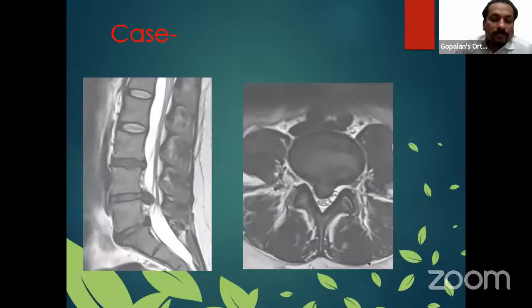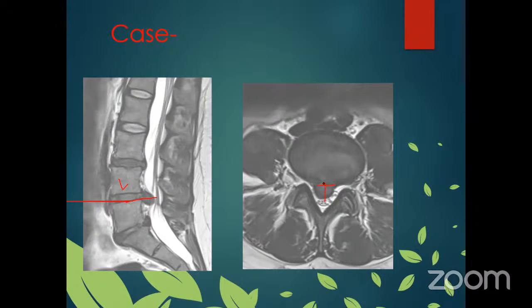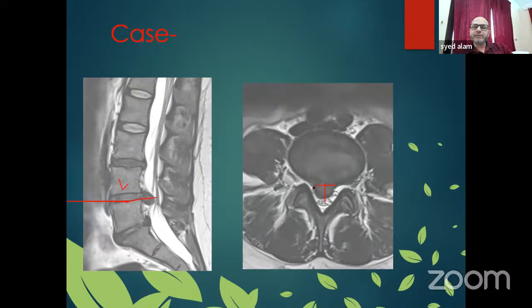Okay, great. Thank you. Again, once more, I keep so many so that there will be no confusion. So again, it's L4, L5. You can see there's a disc. Again, you can check it is crossing the end plate. So disc extrusion. By the other definition also, the height is more than the base. So by both definitions, this is disc extrusion. Then what happened? This is again central and subarticular region, compressing the traversing nerve roots, more on the right side, almost the same.